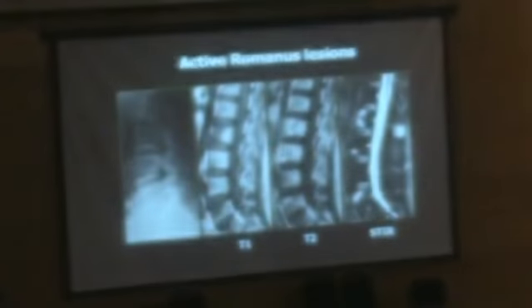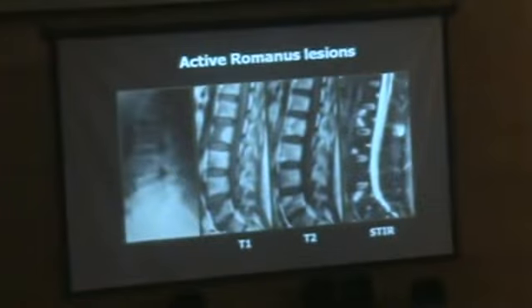So I'll show you some examples. X-ray sometimes is very difficult. What we can see are very subtle changes in the anterior corner. You see, it's really mild sclerosis in some anterior corners, but this can be called unremarkable, a normal X-ray, without any problem.